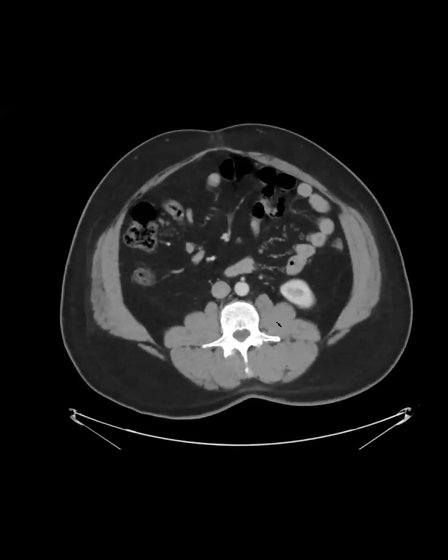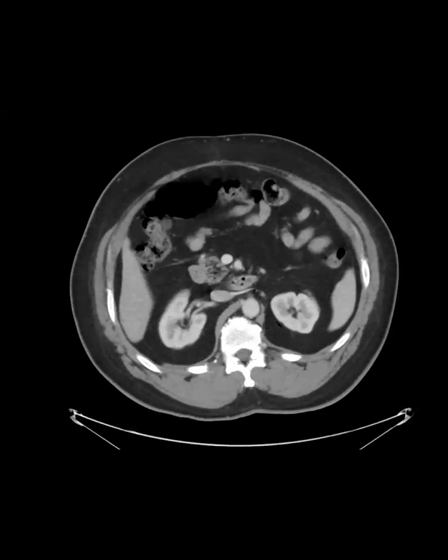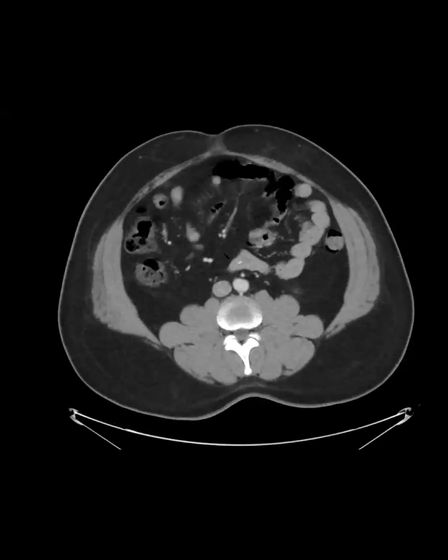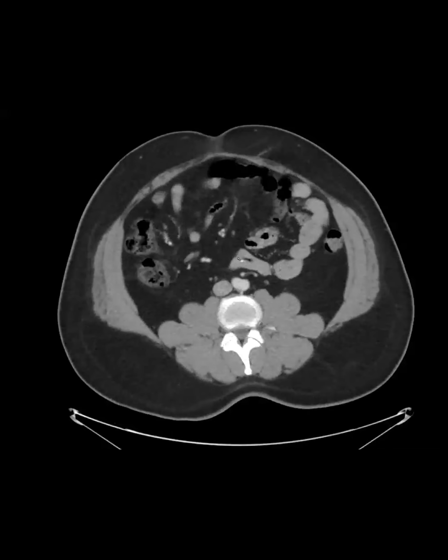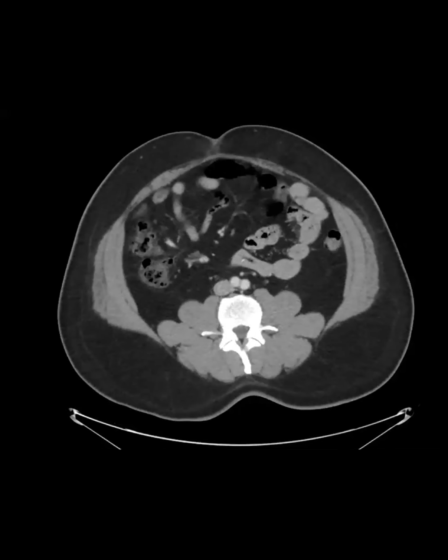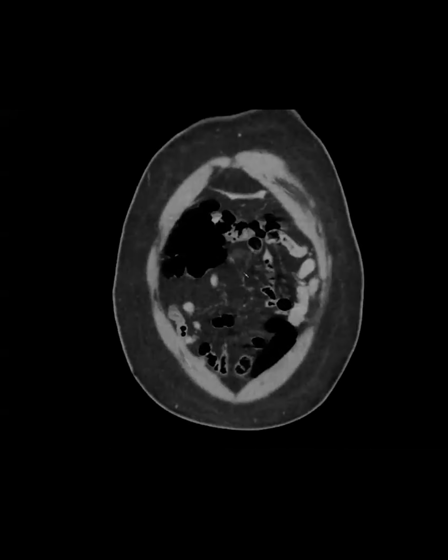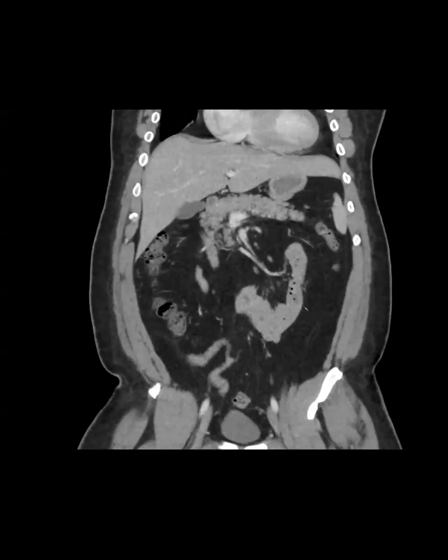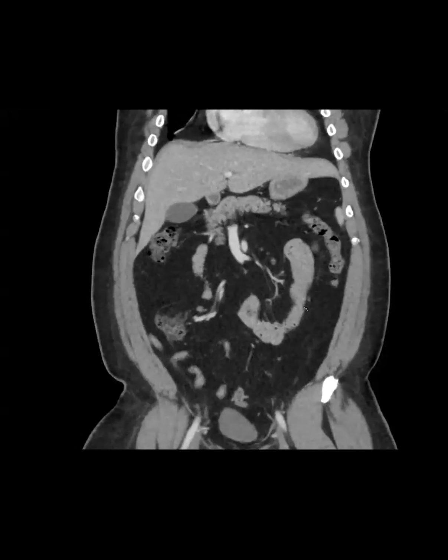Is there something in the duodenum, third portion? Yeah, good. So maybe a foreign body, maybe third, fourth. So something around here. Linear hyperdensity. Would that be a foreign body? Yeah, excellent. If you're wondering about it, you see this pointed thing. It looks like it's going in a linear fashion. The coronal is good. My colleague Amir picked this up and I thought it was a great pickup because you could have easily completely missed it. He said he almost missed it, but at the last minute he was looking at the coronal. So what do you think it is?